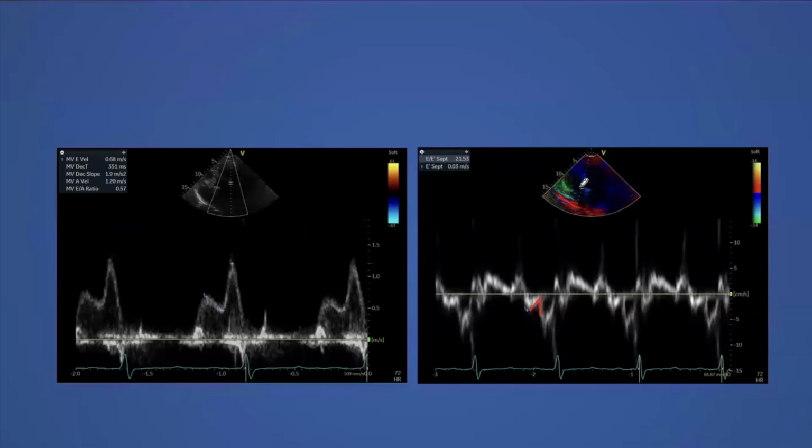But Kim, do you mean it's 2 into the RV? Is that what you mean? Exactly. Okay. Yeah. Often it's placed a little too high, not truly at the annulus, or it's rotated in a 5-chamber, and we're actually measuring somewhere into this sort of LVOT, whatever it is. And of course, that will then underestimate the E prime, which then will push up your E over E prime.